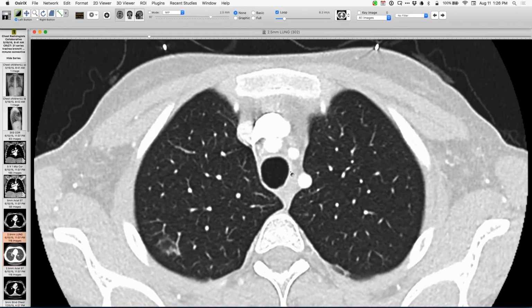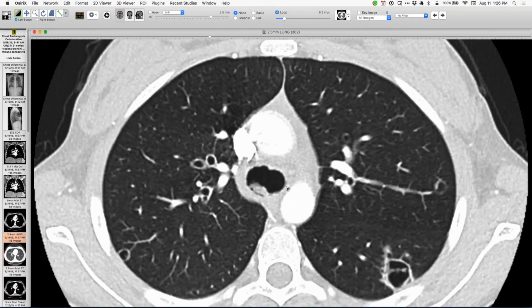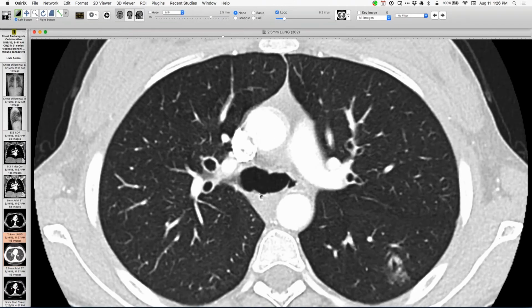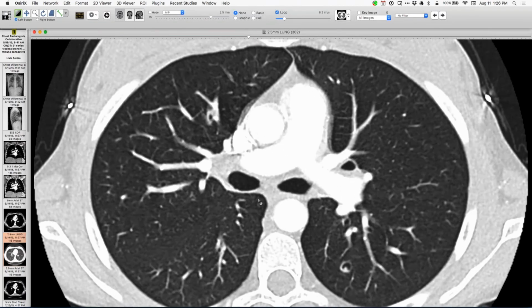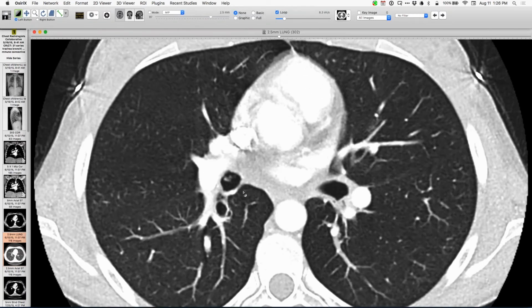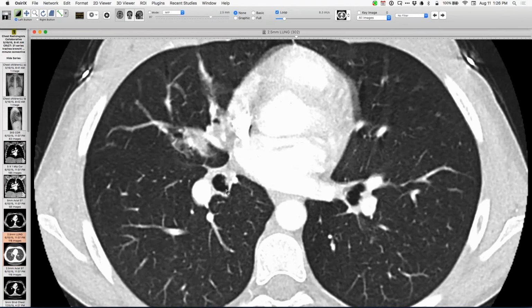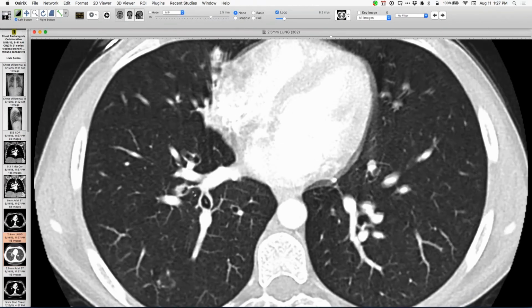So this is, at least morphologically based on this, a severe tracheal involvement with GPA. And here again, at this point I don't know how much is secretion or mucus, but from what I see above, and as we scroll down, I think we have tremendous mucosal injury again in the airways, so a very severe airway GPA as well as parenchymal as well. And here, even down here in the airways.